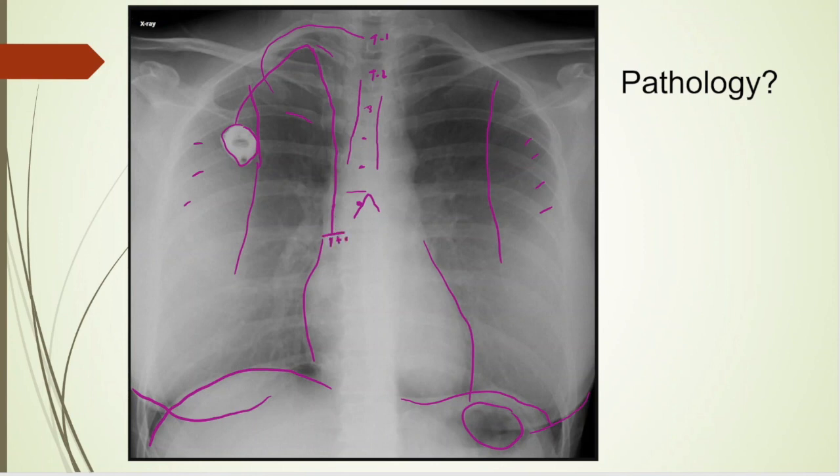So the tip is below the carina. Carina's up here, that's fine. This is long-term use, you want it down lower, and this is right about the cavo-atrial junction here, which is proper placement for a long-term line. So I would say that this is a good X-ray, and the tip is in an appropriate position there.